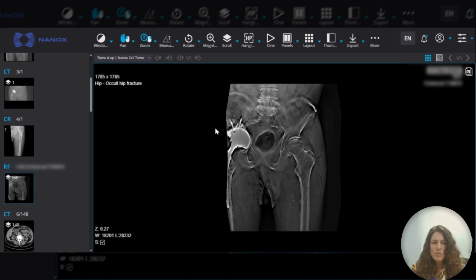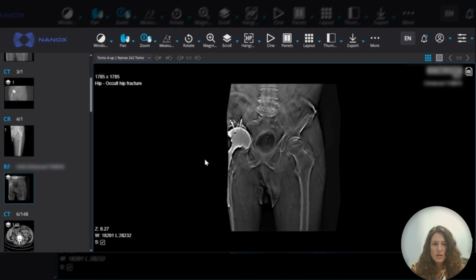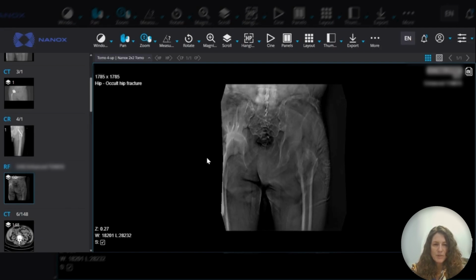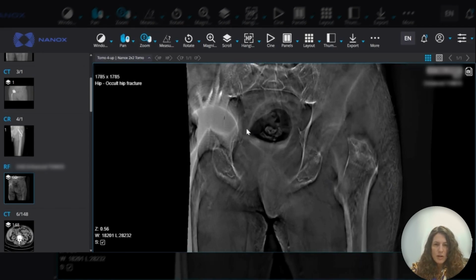The first is in the right hip, you do not see evidence of severe streak artifact as you would on a CT scan, showing the benefit of the digital tomosynthesis and the lack of the streak artifact, allowing evaluation of the bony structure surrounding the arthroplasty. In this particular situation, the patient has left hip pain, and I'm just going to zoom in on the image.